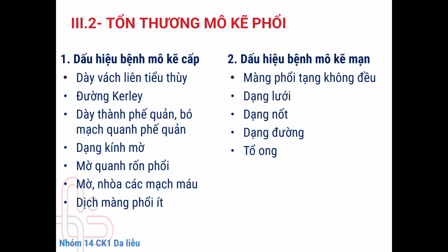By integrating CT pattern with clinical context, distribution, symmetry, chronicity, and associated features, radiologists can narrow the differential diagnosis and identify hallmark diseases such as IPF and NSIP, sarcoidosis, hypersensitivity pneumonitis, and smoking-related ILD.